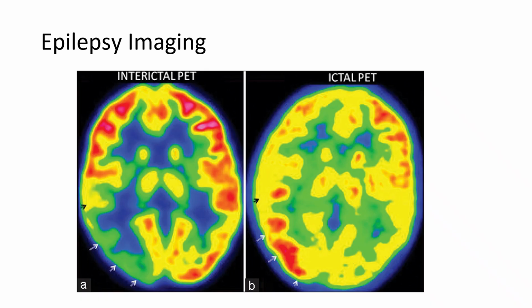It won't always be that specific area of the brain. It could be anywhere. A lot of times you'll see it in the temporal lobes like that. Like I said, it's much better when it's temporal lobe epilepsy. When it's parietal, frontal lobe, things like that, PET is not nearly as sensitive or specific, and it gets a little bit harder to localize where it's coming from.